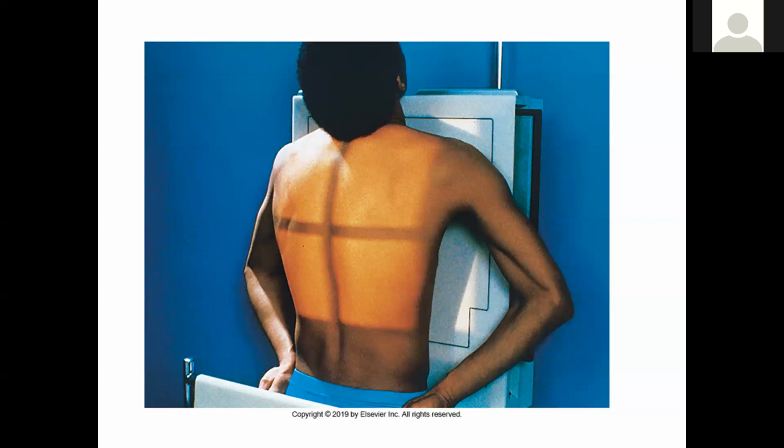So your centering changes, your collimation for sure changes, and because those are more common, that's what I'm going to devote most of the image analysis to, unilateral images. If you have bilateral, it's easy to position. Just center your patient and go.